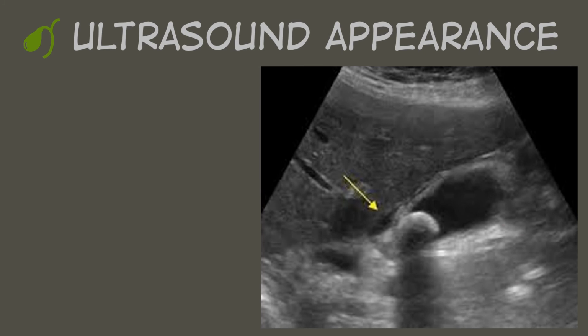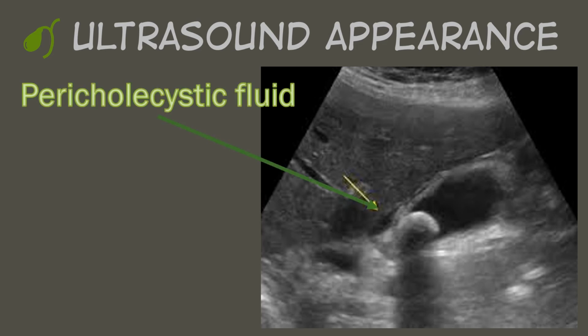Another sign of acute cholecystitis is the presence of pericholecystic fluid. Peri means by, cholecystic is the gallbladder, so it's fluid by the gallbladder. So outside of the gallbladder wall, you will typically see a thin anechoic line that typically represents pericholecystic fluid. Quite often, I feel like we see it a little bit more in between the liver and the gallbladder. Sometimes you will see it on the other side towards the fundus as it kind of drapes into the intestines. So make sure you're looking at where that fluid sits, both supine and decubitus.